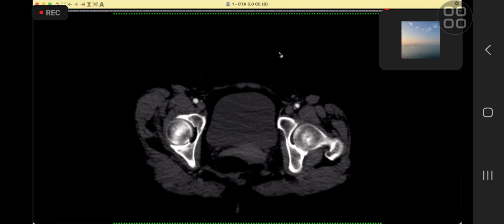This is a cardiothoracic or vascular emergency. I'll immediately pick up the phone and inform the vascular team of the finding. Also, I'll discuss the case with the interventional team. I think this patient may benefit from control of hypertension and EVAR, endovascular aneurysm repair.